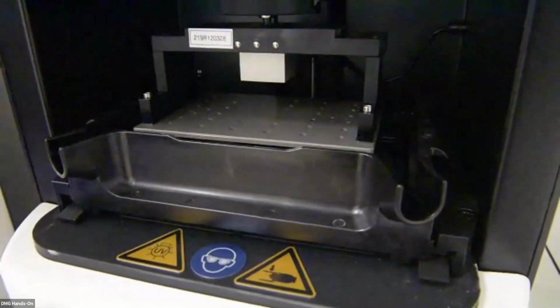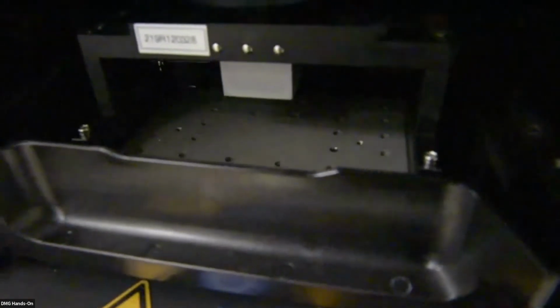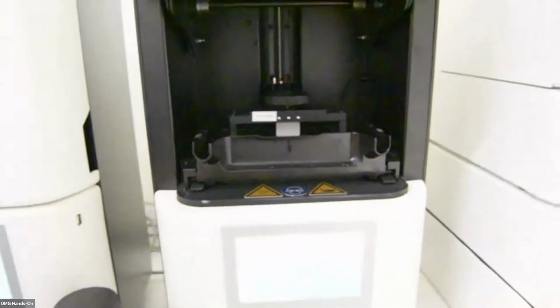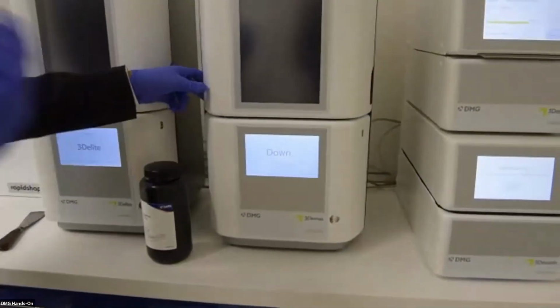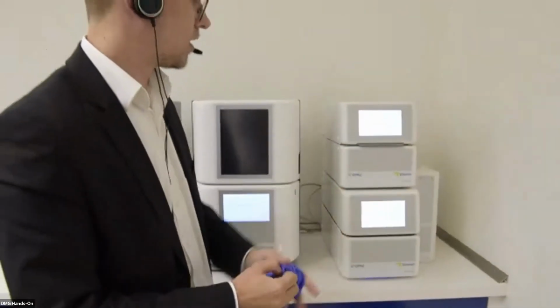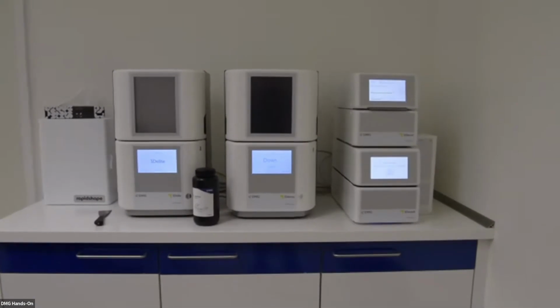I think you can't see it, but inside the material tray is the Luxaprint Ortho Plus, which is liquid and transparent, of course, so maybe you can't see it very well, but now the printing process starts, and it will take roughly half an hour. I will close it again because, as I already told you, it's light sensitive. I will stop this device as well, so the noise stops, and I will go back to the computer and go on with the presentation, but only a few slides are left.